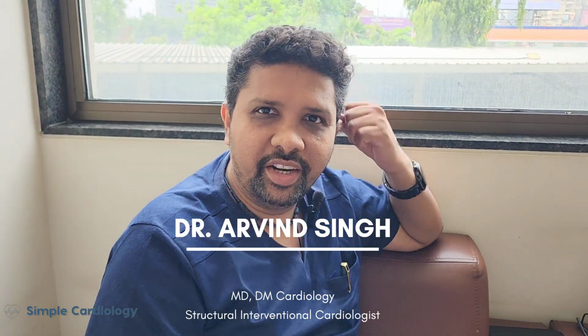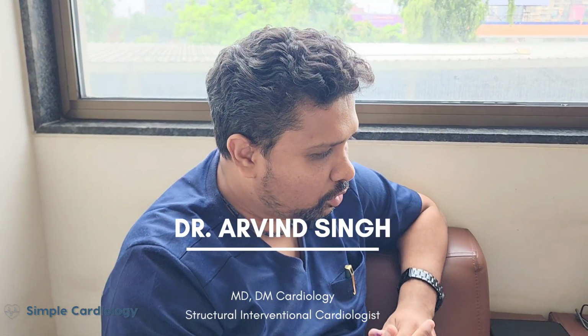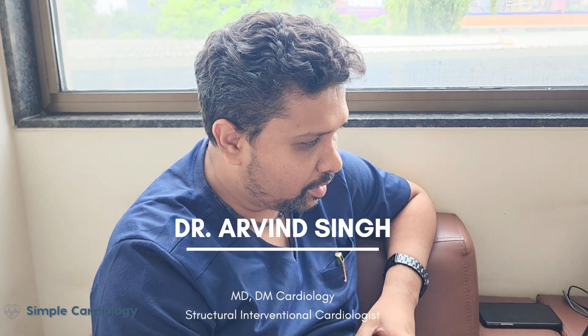Hi friends, today I would like to show you a CT scan and something new like a 3D print of a patient who is suffering from a unique condition. He is a case of rheumatic heart disease who had undergone double valve replacement, aortic valve and mitral valve way back in 2006. He developed a paravalvular leak within 2 to 3 months of the operation, but it was managed conservatively for a very long time.